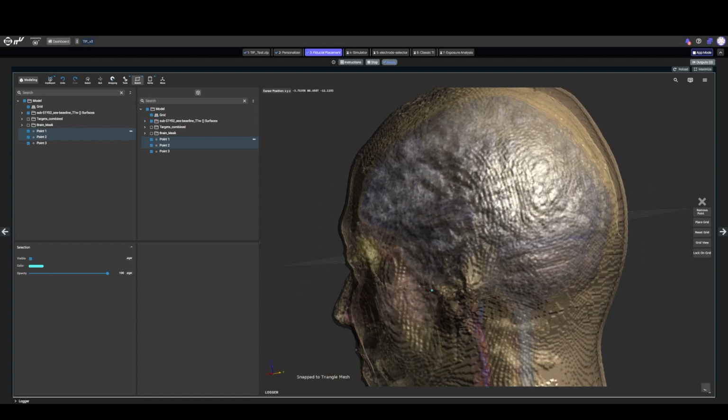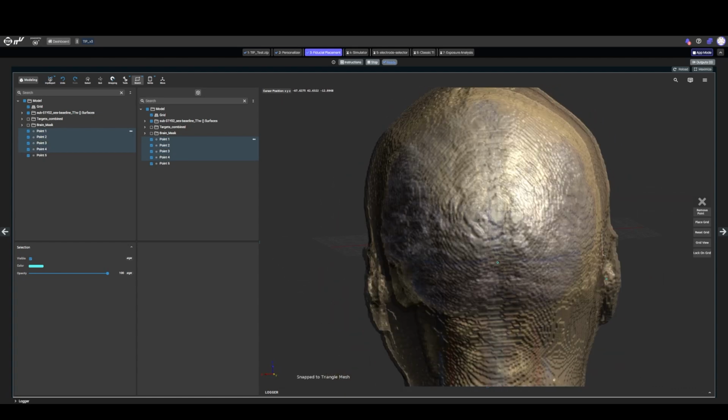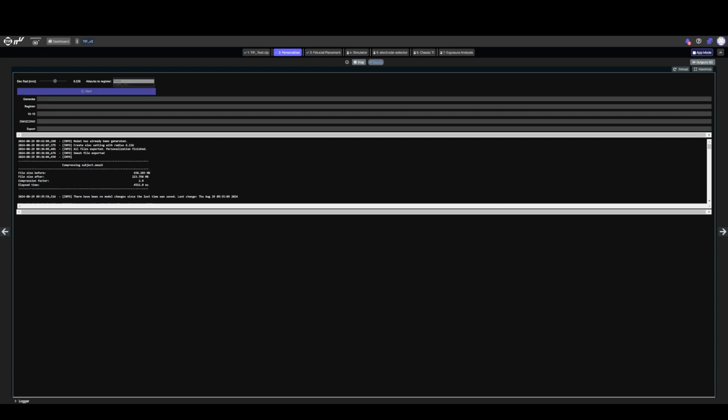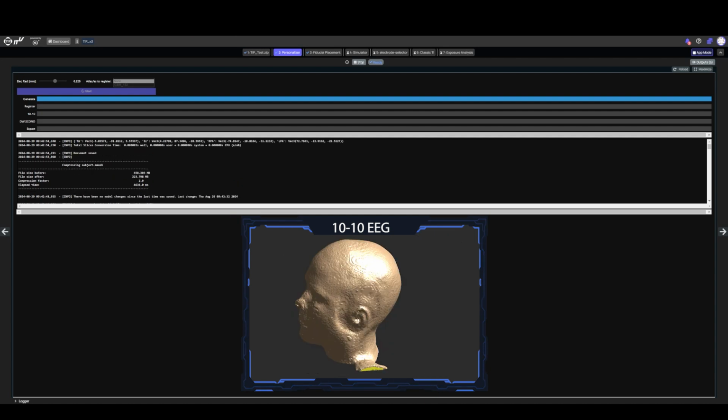In the model view, users can then place the 4 fiducial points, which are the basis for the automatic placement of the electrodes. After exporting the points, electrodes are placed as per the standard 10-10 electroencephalography system. Optionally, anisotropic conductivity maps are assigned based on the DTI data if such files have been provided in the TIP input directory.